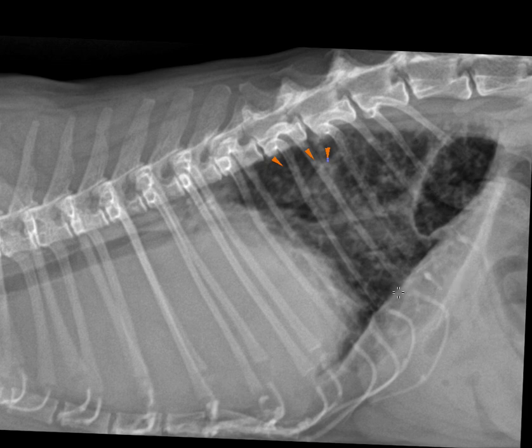You may notice that I keep saying lines and rings or donuts and railroad tracks, but I'm mostly pointing out rings, and I haven't really pointed out any lines. I'm going to show you one example. I'm going to try to put arrows on both sides of the railroad track. Here's an example of a little railroad track.